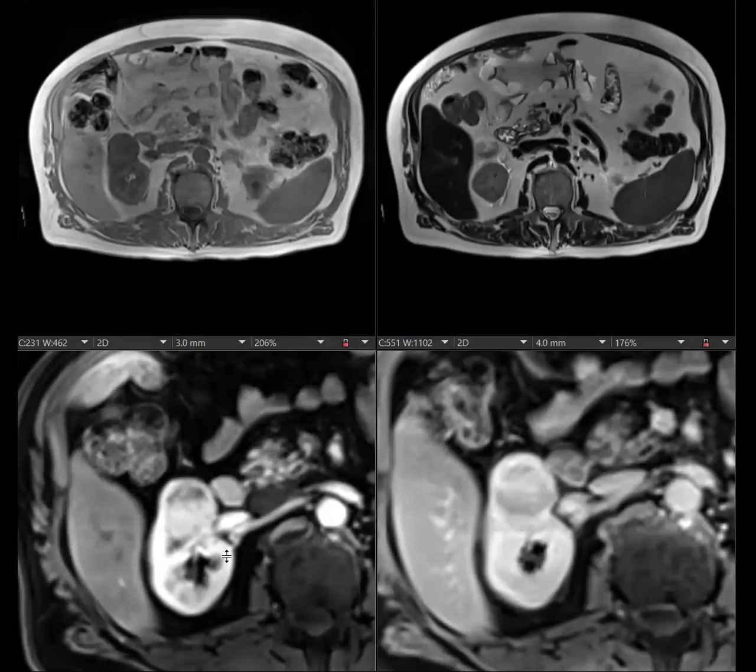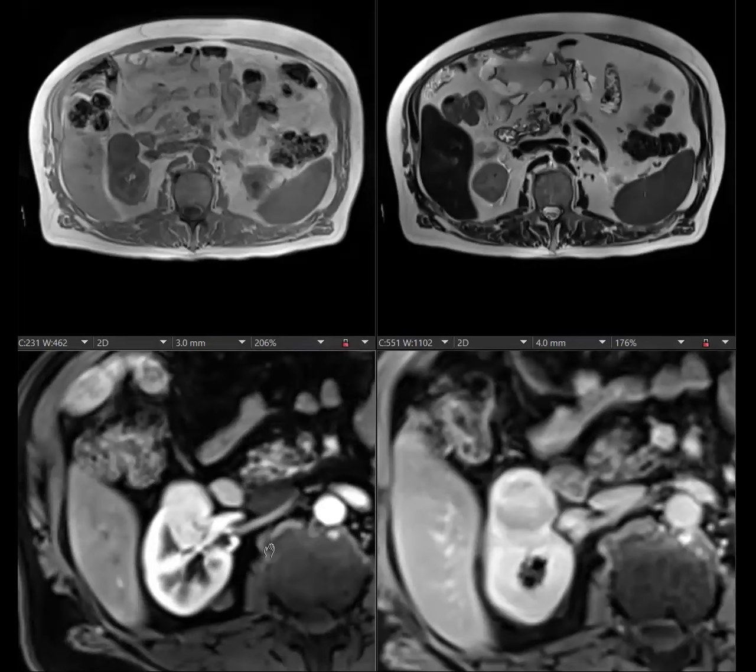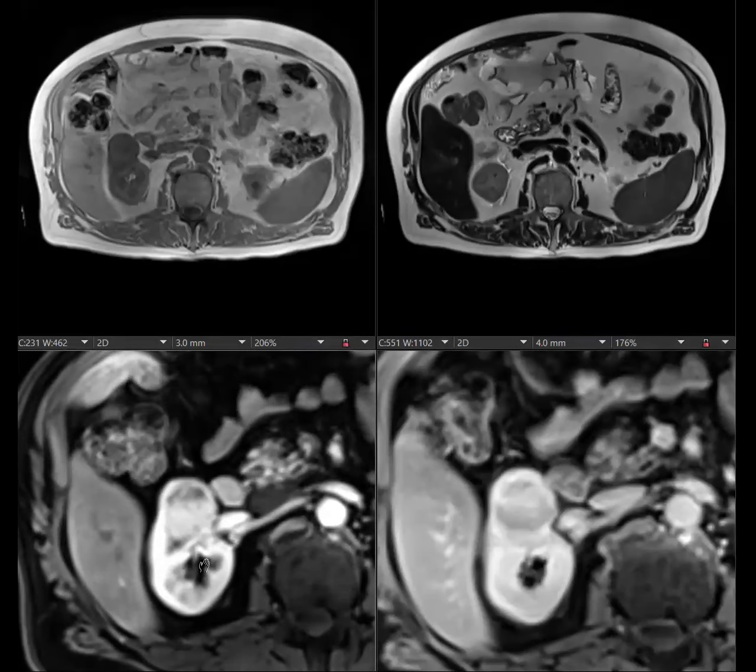So here is segmental arterial enhancement inversion, the part that's dark. For example, anteriorly, oh no, wait, it's getting a little brighter. And then this posterior part that's arterial bright is getting darker. I would call that segmental enhancement inversion. Oh, I didn't catch that when I was reading it, but I think you're right.